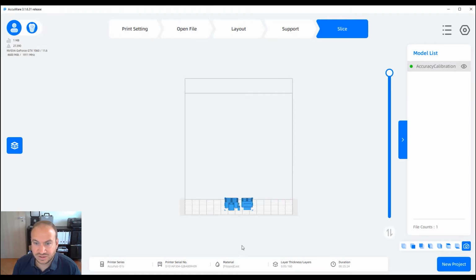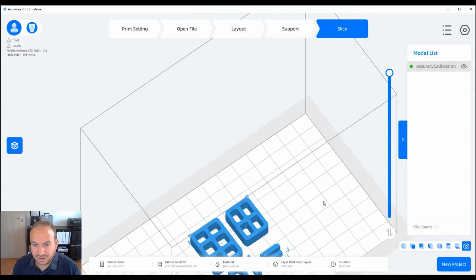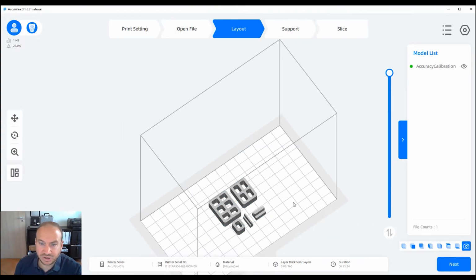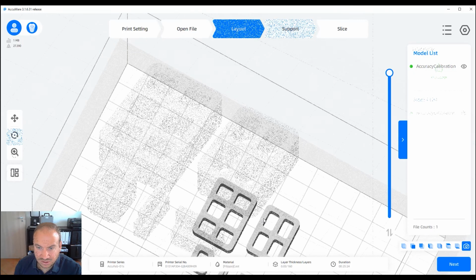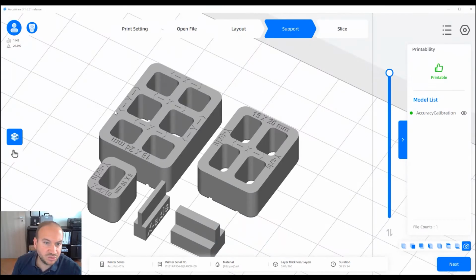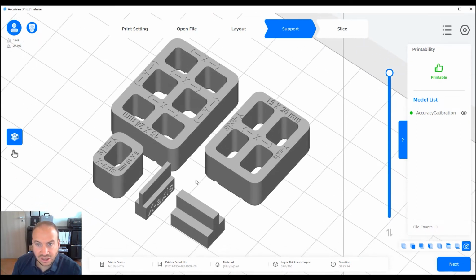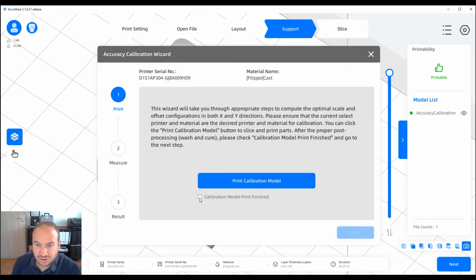Sorry, I've already created the slides, by the way. Yeah, here by default the printer will import these files automatically. Okay, so as you can see, on the object we have X and Y indications, which means that with the caliper it should be necessary to measure those objects and report the measurements.